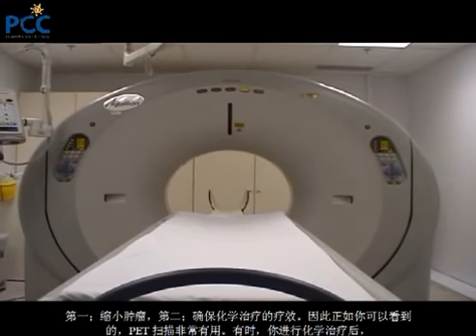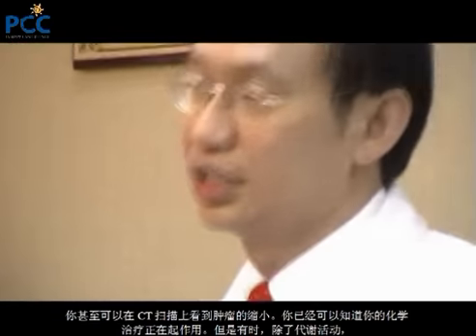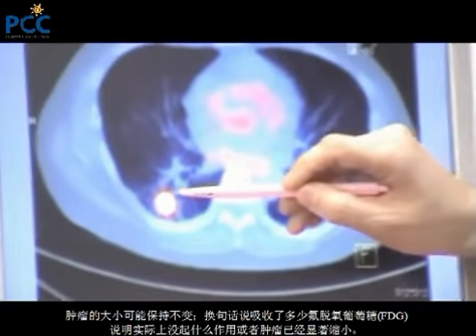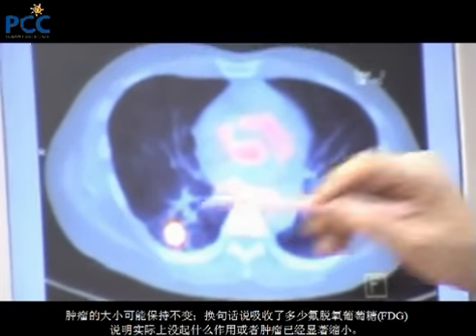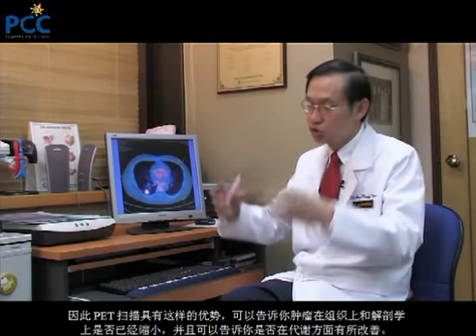Sometimes, all right, you give a chemotherapy, you will see that the tumor has shrunken even on a CT scan. You can already know that your chemotherapy is working. But sometimes the size of the tumor may stay the same, but the metabolic activity, in other words, how much FDG it uptakes, actually has gone down to nothing or it has diminished significantly. So the PET scan has the advantage of both telling you structurally, anatomically, whether it has reduced in size, and also metabolically, whether it has shown improvement.